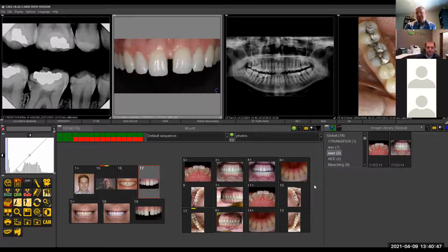Sorry, I'm interrupting. One more question on when you save the data. I noticed that window pops up and says, save all, delete all. On the software I'm using right now, when you're grabbing a picture, it's going directly onto the server. And let's say something crashes in the middle of that. Those images, I've never had one lost yet.